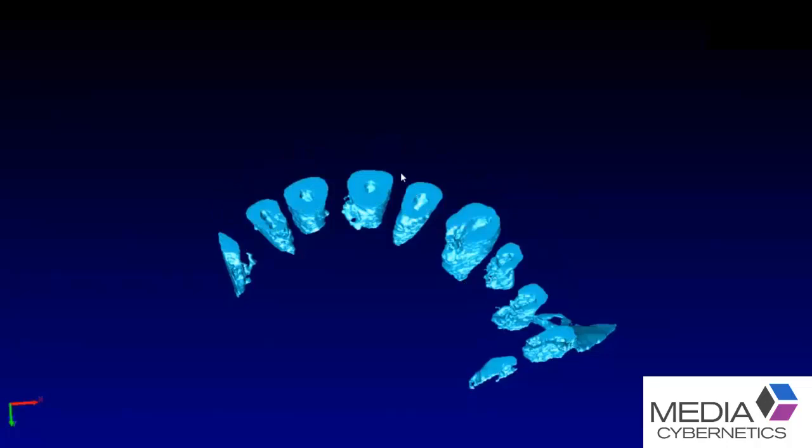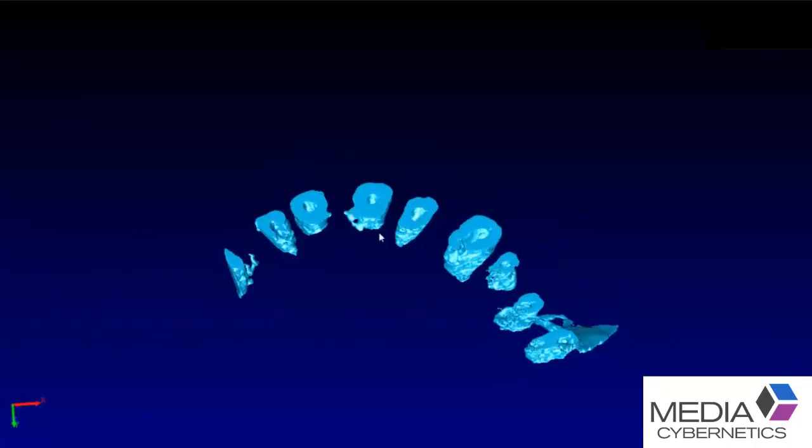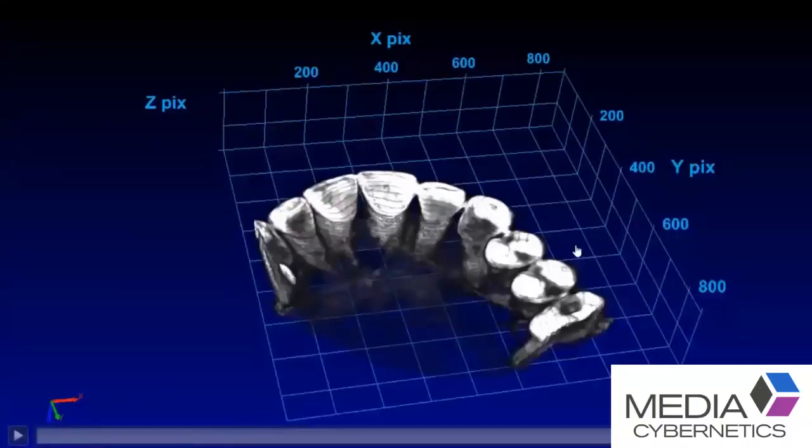And then by using orthogonal, or I don't remember if they're perpendicular orthogonal planes, you can start sectioning through the bone, and you can see, within the bone, there are openings where maybe the nerve might pass and things like that. Again, I'm not a dental specialist, but this is pretty necessary. So again, making sections through here, they have different ways of looking inside the tooth.